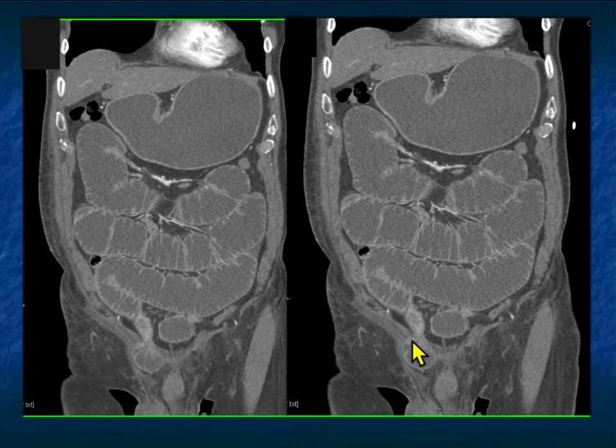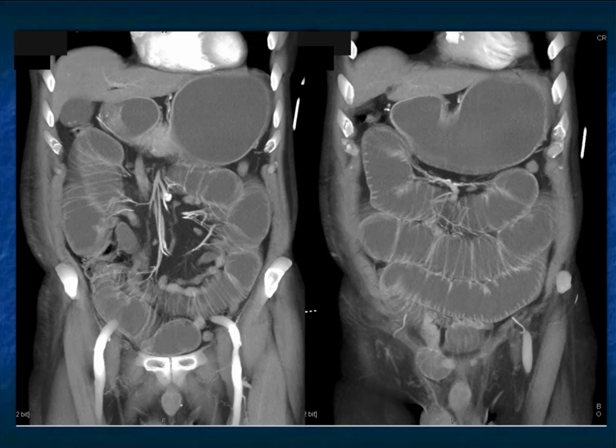The bowel loop is going into the hernia. Now, sometimes you can reduce some of these hernias at the bedside and not need to go to surgery, but most of the time you can't, and you're worrying about perforating the bowel. When I look at these hernias, the fact that I see a little bit of fluid in the hernia sac makes me worry about ischemia. Once you worry about ischemia, the patient, whether you can reduce it or not, is going to go to the OR. So, just a very nice example.